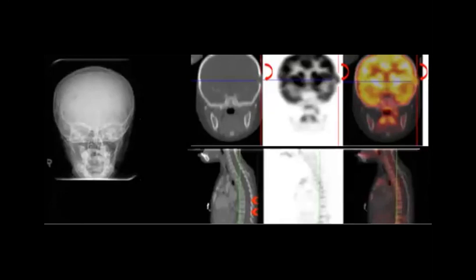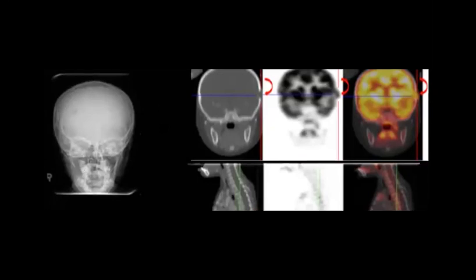You can see the skull and try to find that he's young age, right? Do you see any abnormality? Look at just the X-ray first. Try to describe the X-ray, then maybe you will get the answer.